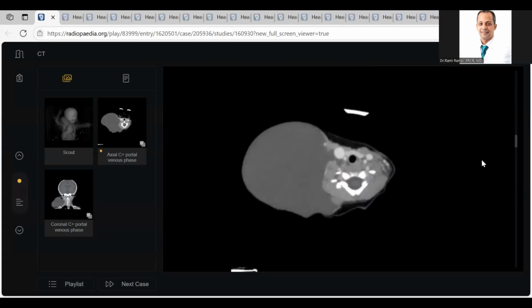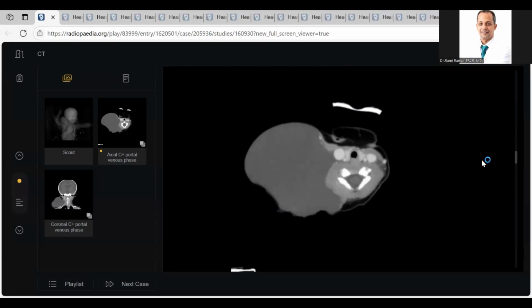So to conclude on this plain film, I think my first differential would be cystic hygroma or lymphangioma in this 3-month-old child. Excellent. As these have association with Turner syndrome and chromosomal abnormalities, I would suggest to review any other associated findings and would immediately inform our findings to the clinical team. And I think this would also be appreciated maybe in the obstetrical scan, which was done antenatally. What other differential diagnosis?